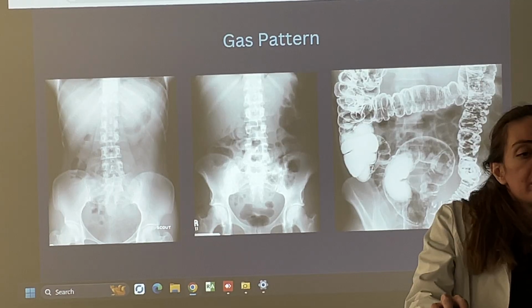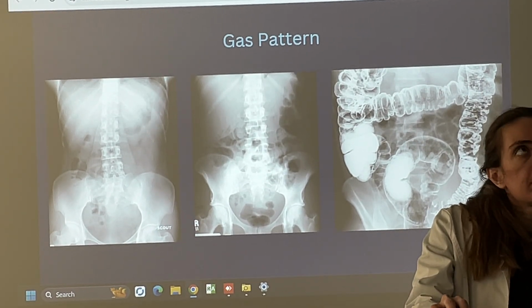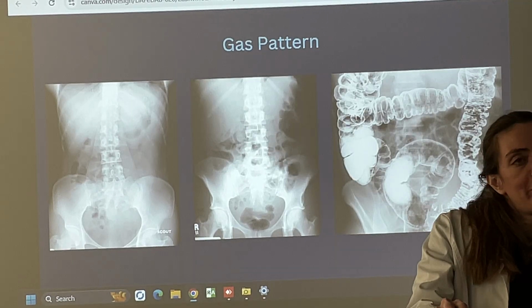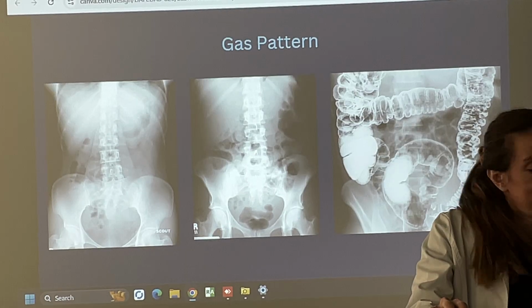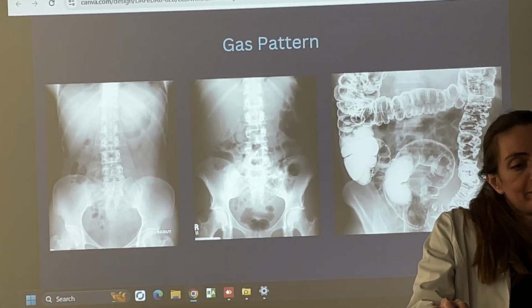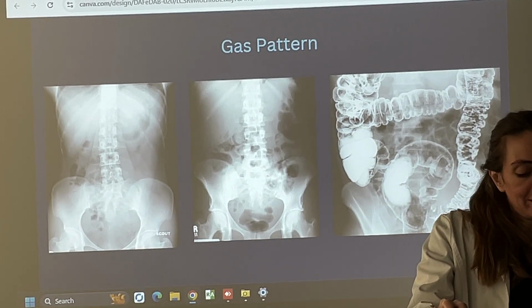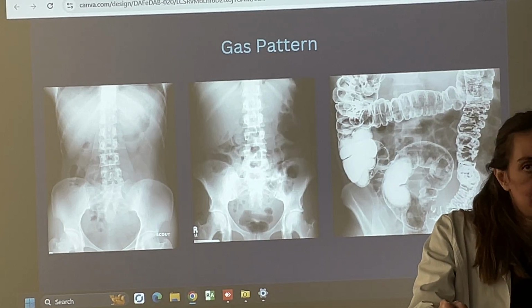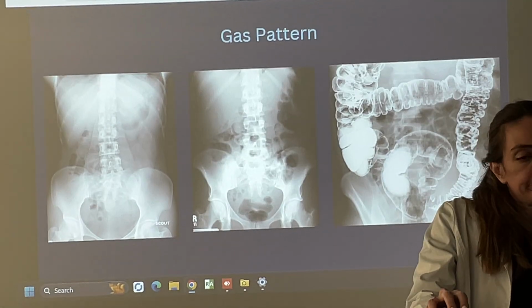It's visible. So in the stomach, there is almost always air, unless, whenever food is stored, maybe while eating, I guess. Unless there is a nasogastric tube attached to suction, and also if the patient has recently vomited.